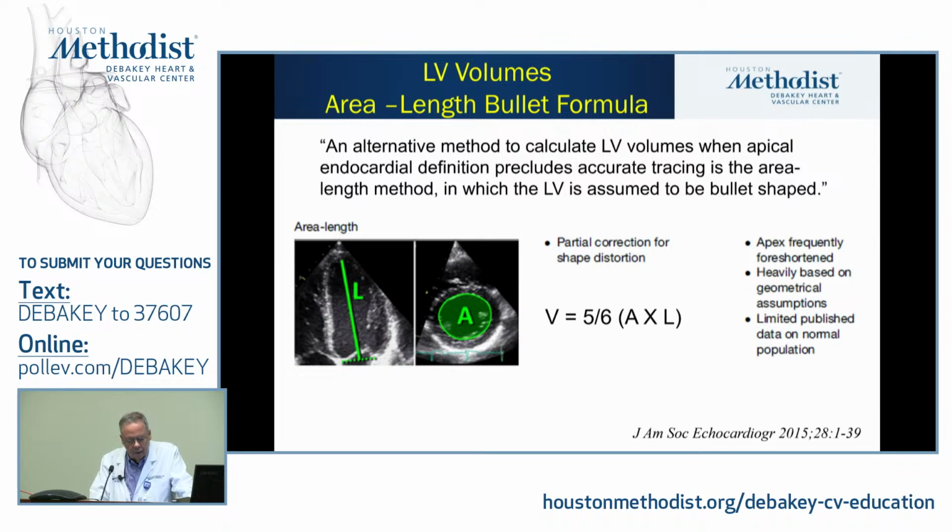and you can get volumes and EF. Now, obviously, because you're using the short axis area at the level of the papillary muscles, this works better when the ventricle is equally good, equally bad. But the more regional wall motion that you introduce, this method is going to have problems, because it cannot recognize, for example, a dyskinetic apex or a significantly akinetic inferoposterior wall. So it's better when you have diffuse hypokinesis or just normal wall motion.